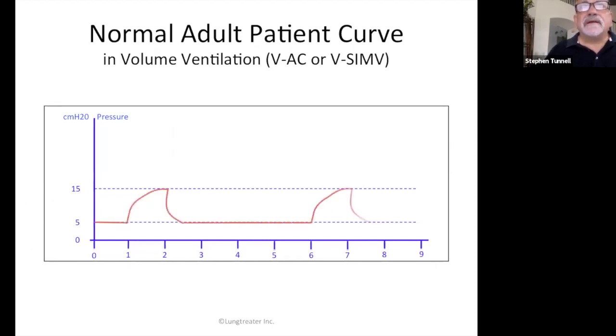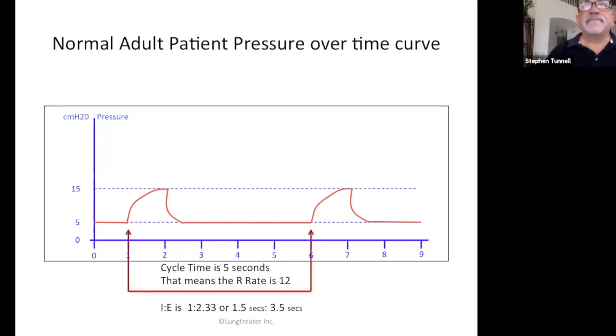Here you see airway pressure pushing gas in and letting gas out. As it goes up the curve, air in, air out. In the old days, we had bellows that would move up and down. Now we have waveform screens.